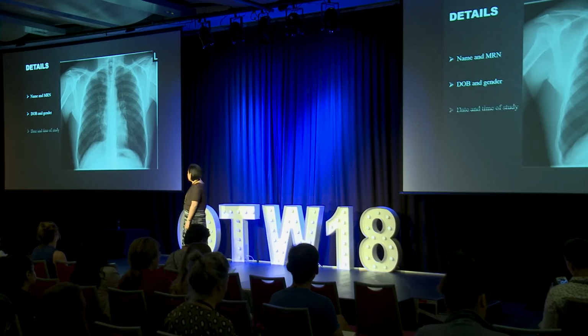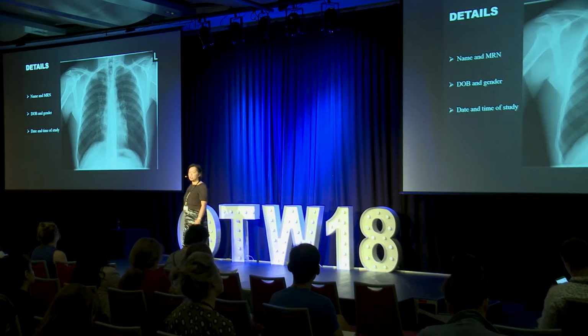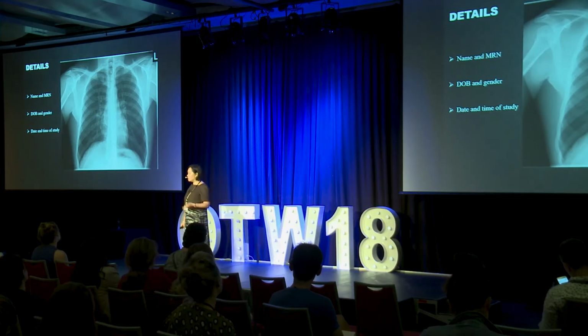Then next, I'll check that the time and the date are for the scan that I'm looking at, because even though it's the same patient's X-ray, it might have been done a couple of years ago, or even on the same day. Some patients, especially in ICU or ED, might have multiple chest X-rays in a day, to check line positions, or because the patient's condition is deteriorating. So you've got to make sure that you are looking at the most current examination.